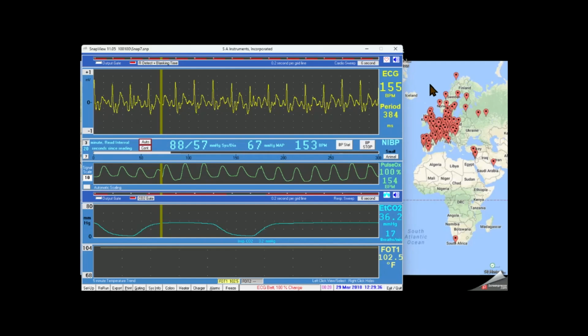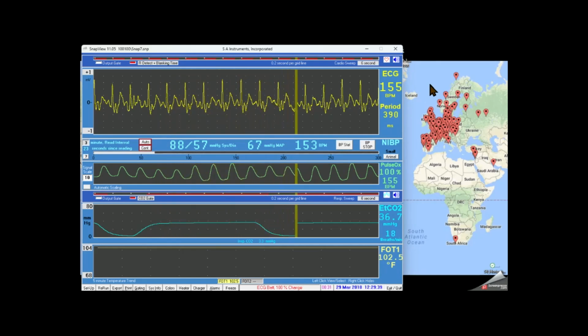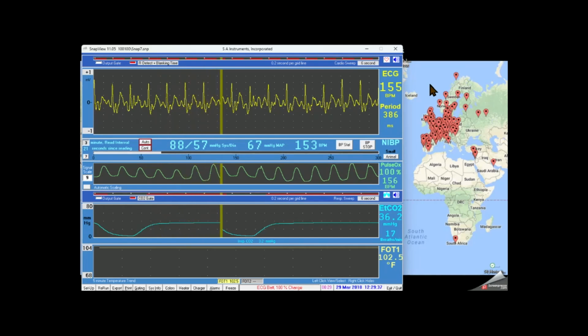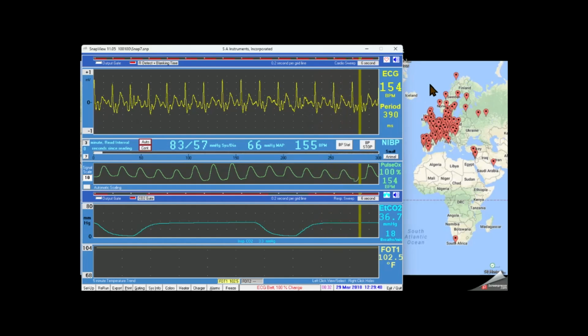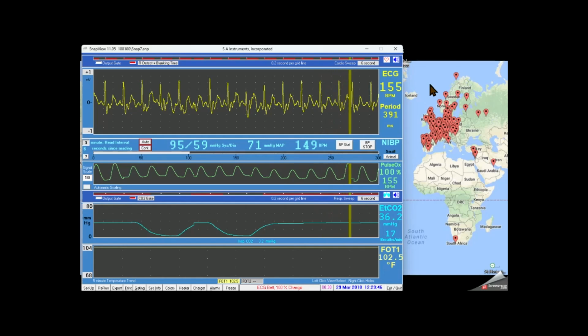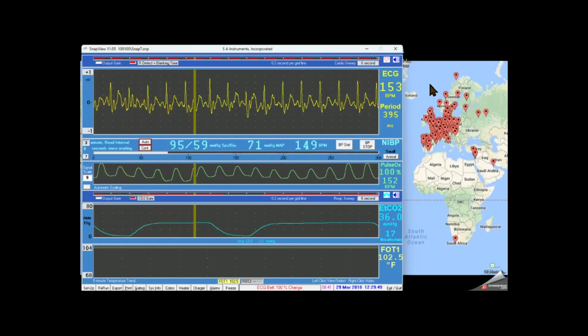The presence of the white dot indicates that a trigger pulse has been output from the system's control gating module. When gating is implemented, the output gate is sent to the scanner's control electronics to allow image data to be acquired synchronous with the cardiac and/or respiratory cycle. This allows cardiac and blood flow images, and images free of cardiac and respiratory motion, to be acquired. A detailed discussion of gating is covered in the 1035 operation manual and a separate video.